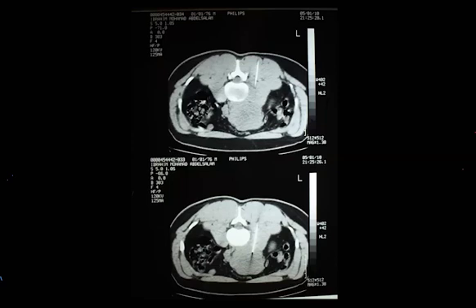As Dr. Mona was commenting, she said that this man was prone. This man was prone, so you can see the vertebral bodies on the front and not on the back. But this man, paradoxical to all the... because you know we've already standardized the method to position people when they're being axially imaged.